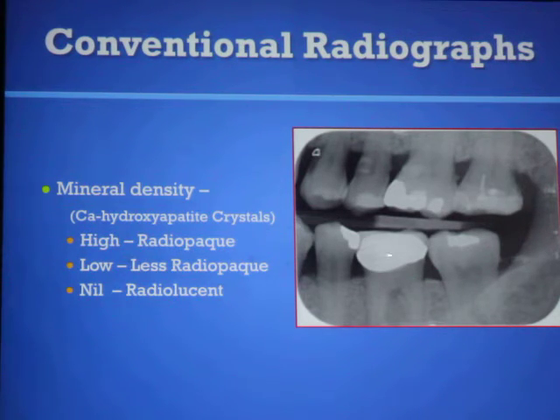As we see, that's very high density, and we can separate it from the gingival tissue that generally sits here, because there is a contrast between two objects. That helps us identify enamel, amalgam, composite, bone, dentin, and pulp. All can be separately identified because they are next to each other, creating sufficient contrast for us to recognize them on the radiograph.